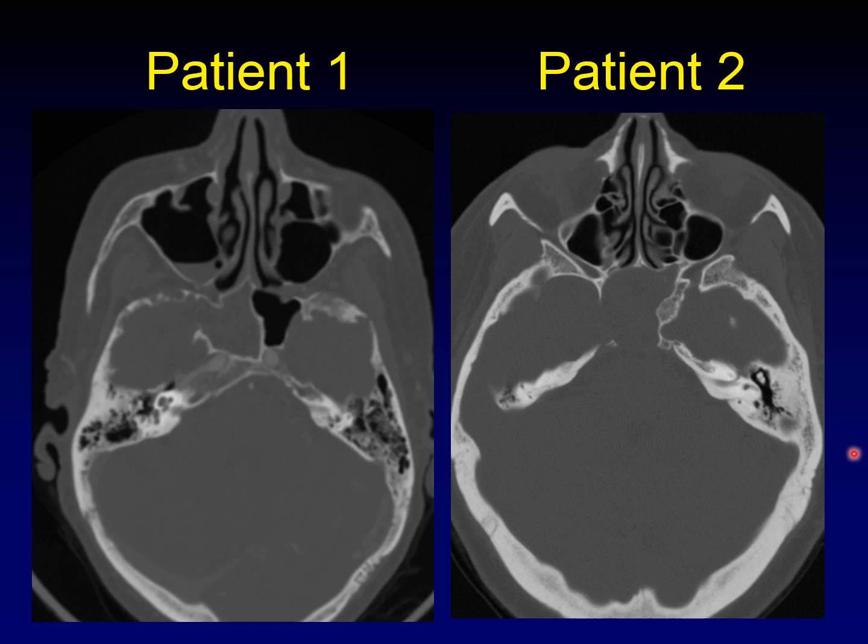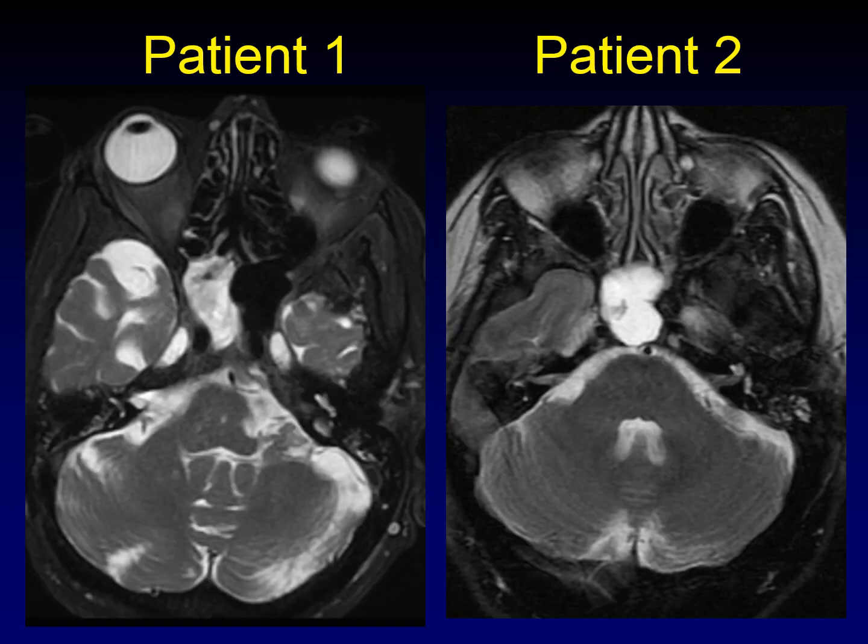Here's the part where you pause this lecture and see if you can figure out what the two diagnoses are, and then I'll go over these two cases. This is a tough head-to-head. These really look very much alike, but there are some important clues that can help us differentiate them.